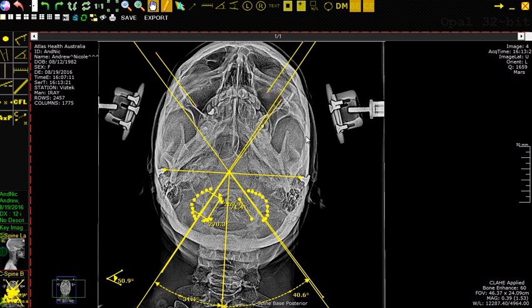But it would be lovely to be able to identify these few structures. If we're able to identify anterior point 1, posterior point 1 on the left side and then on the right side, identify an outline where it makes a nice arc representing the lateral mass, and then just dot on the two earplug references, and boom, all of these calculations come out automatically, that would save us all an inordinate amount of time.